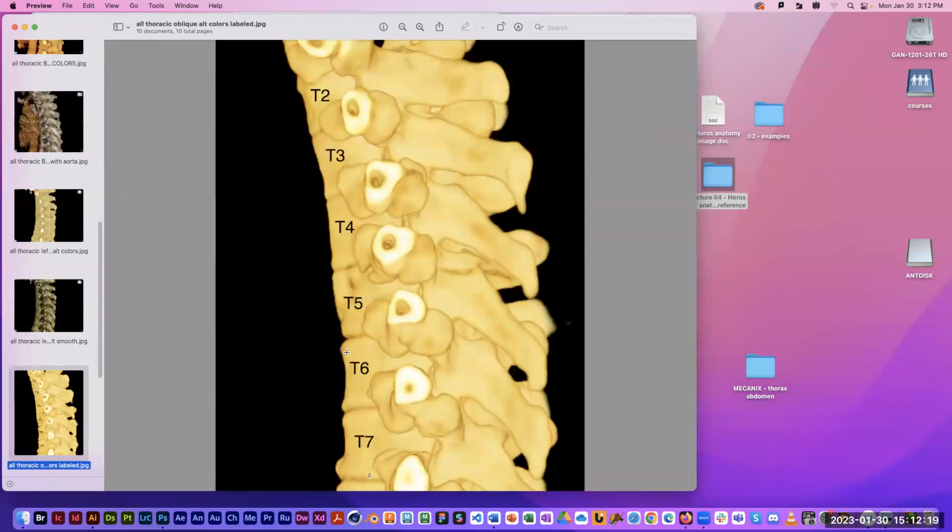So I actually numbered the levels so I could see them myself. You can actually see the fracture there continuing over into the right transverse process.